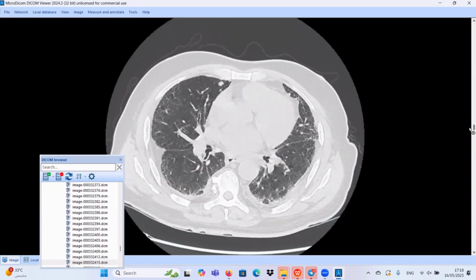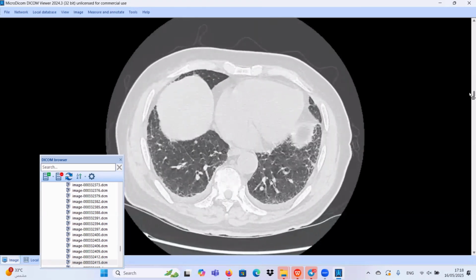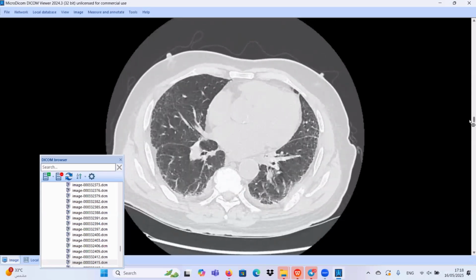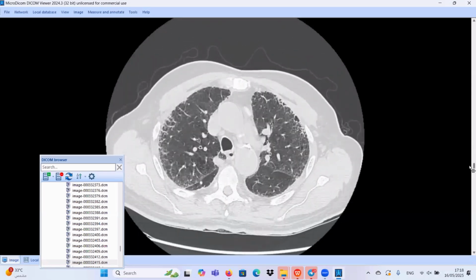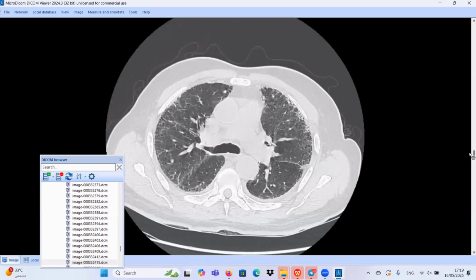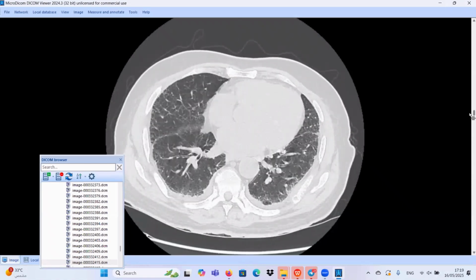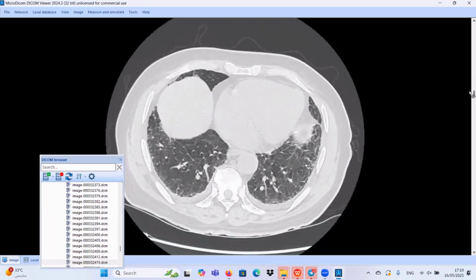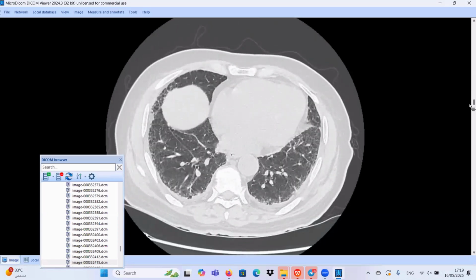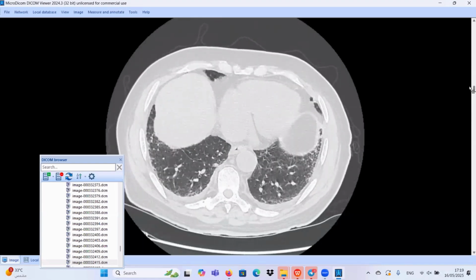This is an HRCT image, lung window, of the same patient. My findings of interstitial changes are demonstrated. They have an apicobasal gradient. There is bilateral pleural effusion. There is peripheral honeycombing as well. There is some fluid tracking along the fissures as well. And next, I would like to see the soft tissue window. There is also some element of pericardial effusion. Let's see the mediastinal window to check this point.